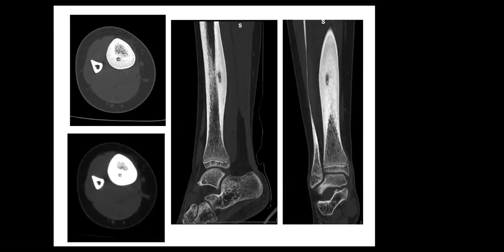Yeah, what's the name for that in pediatric population? Brodie's abscess, maybe. Yeah, Brodie's. So Brodie's abscess is your main differential diagnosis. Do you think bone scan will help you differentiate Brodie's abscess from osteoid osteoma? Yes, bone scan can differentiate it. How can you differentiate osteoid osteoma from Brodie's abscess?